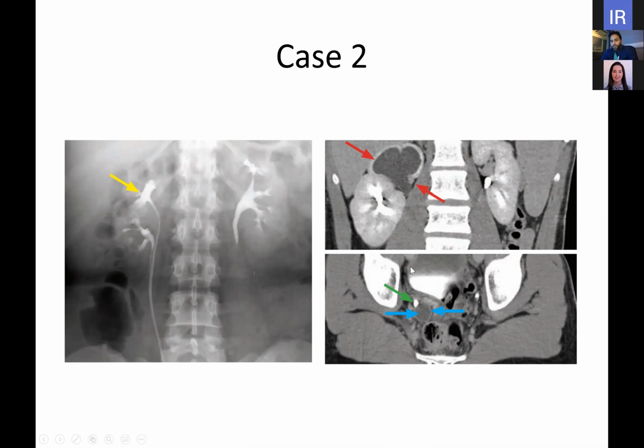In the pelvis, as we follow the ureter, we have one single ureter here on the left. We have another here on the right, but we have a dilated tubular structure just here behind this contrast-filled normal caliber ureter.